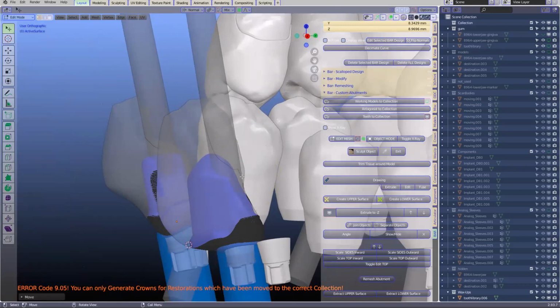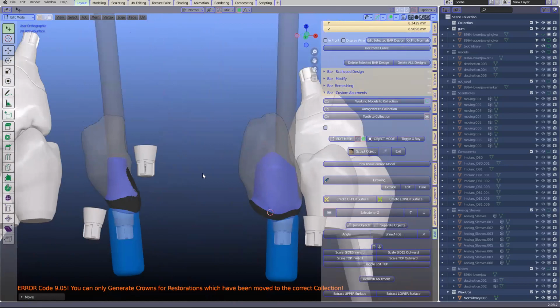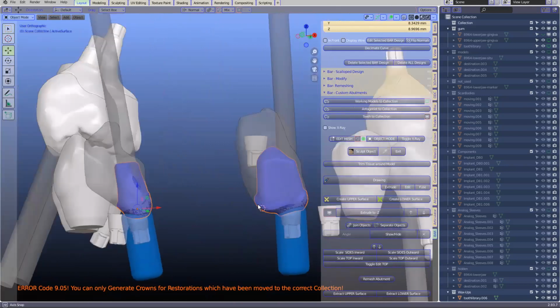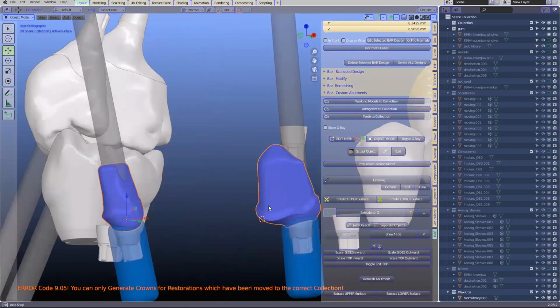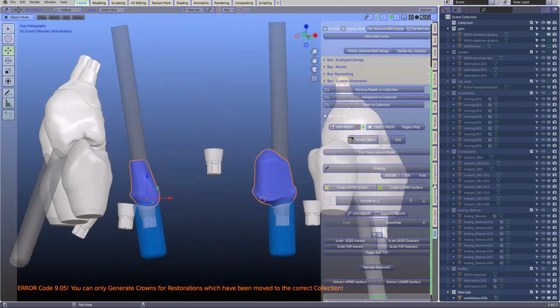Whichever you like. Yeah, so we can bring this mesh in a little bit. Now what we've got is less parallel surfaces, but only one surface is less parallel, the rest of it is okay. Exactly, and it's going to be bridged. Yeah, it's a bridge. All right, then we just carry on as usual.